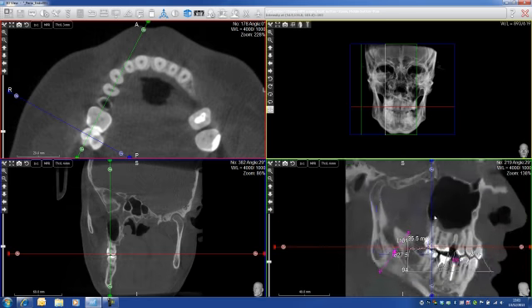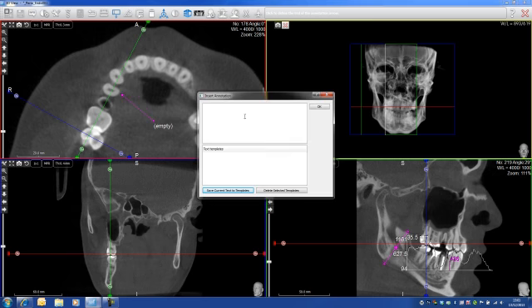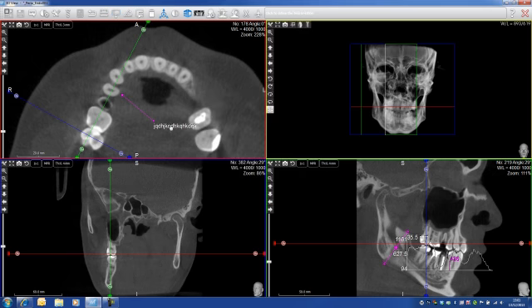Okay. Right, next. The new functionality is the possibility to annotate a particular command. I can come here and type a text, any text I want, and press OK. And of course I can move it around if I don't like it. If the arrow is not precise, you can take it with the left click and move it around.